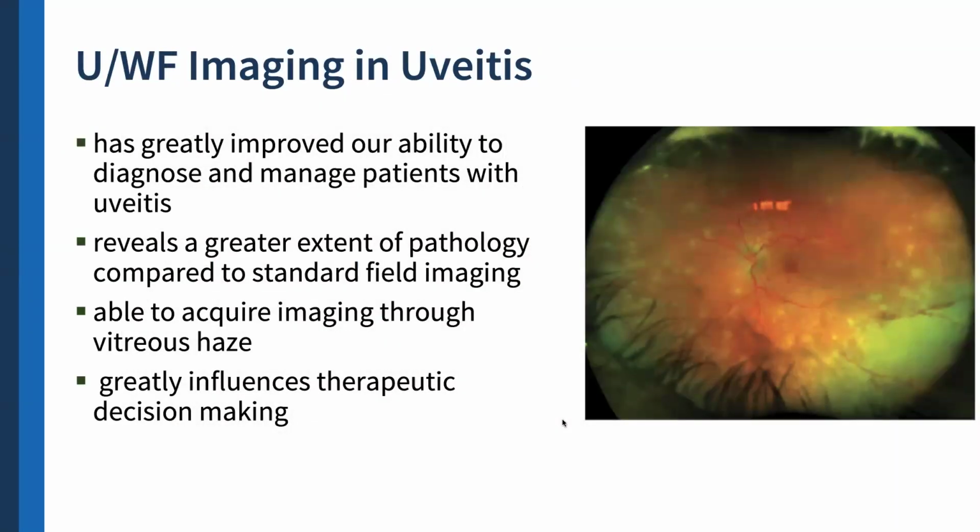Okay. So last part of the discussion would be just a little note on ultra wide field imaging. Because nowadays we're now moving towards ultra wide field imaging, it has greatly improved our ability to diagnose and manage these patients, and we now see more because of the greater field of view with the new machines.